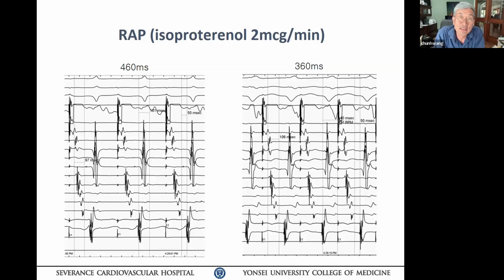I think you're basically ablating the left side pathway, concealed mostly. And then what you see in different degrees of aberrance is by pacing rate. Sometimes you can have a sinus rate. Your first ECG, your sinus rhythm occasionally got slightly wider and narrow. That really doesn't bother me. I would not buy that as a pre-excitation. It would make sense if your heart rate suddenly increased and it pre-excited. Yes, that would make more sense. Not at the same rate. That's what I have to tell you.